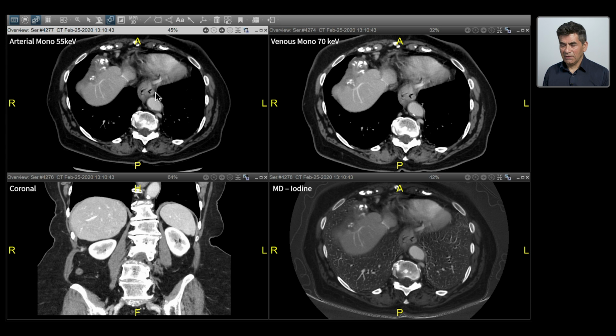Now, first thing I would say is post liver directed therapy, there are many changes that happen that can deceive us on conventional images. And our goal is to assess if the tumor has been treated. Is there a viable disease that might require retreatment? Or if there is additional lesion, that means disease has progressed and we might have to consider alternate options.